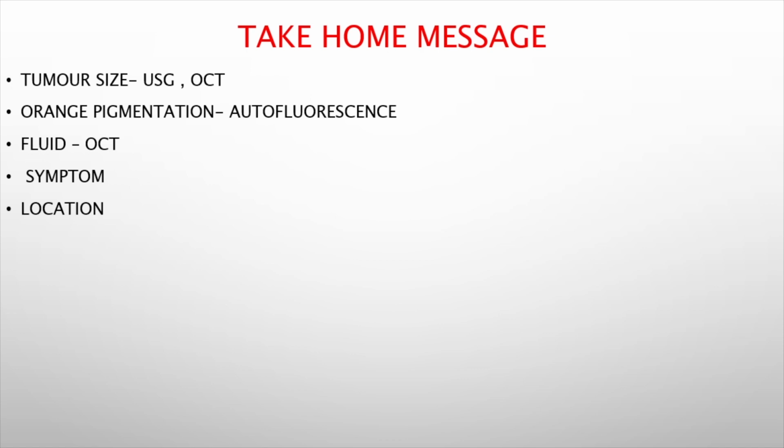Why did this patient have fluid at presentation? Not here, outside. What are the reasons for the fluid? A choroidal nevus can be associated with fluid. It is not that every time fluid is there, it has to be a melanoma. You can have an associated CSER also, apart from that. Some people call it a leaking nevus, but there is actually no leaking nevus. A nevus itself can present with fluid, and that can be treated.